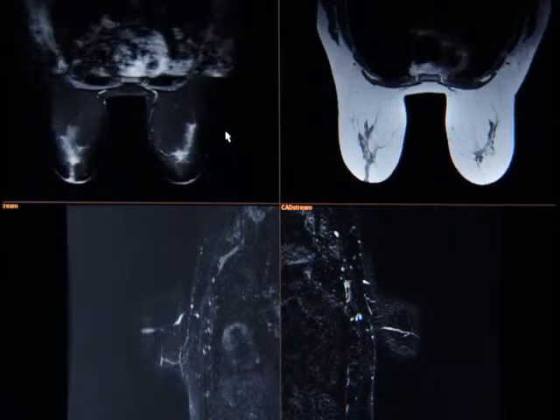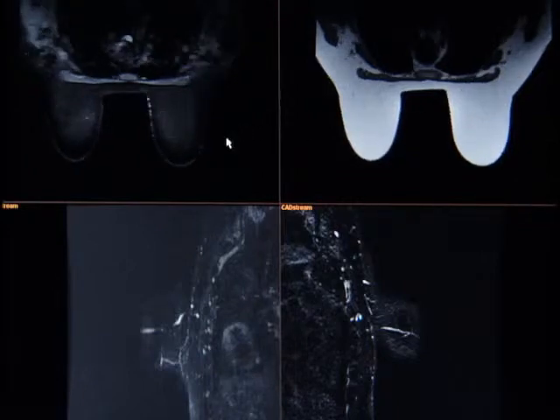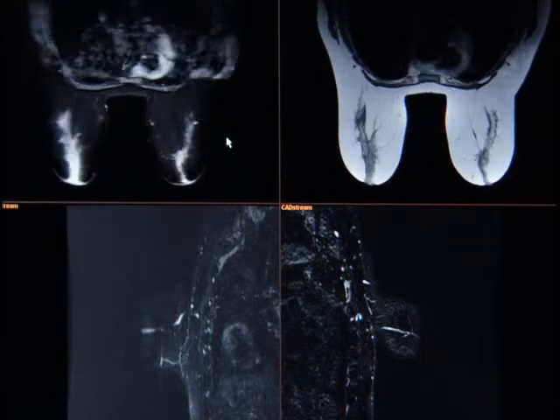I would then go on to delineate cysts or asymmetric breast edema. There are no dominant cysts within either breast, period. There is no asymmetric parenchymal or skin edema, period. No lymphadenopathy is identified, period. Again, you can see on these high-resolution images, you're able to evaluate the axillary lymph nodes, looking for normal reniform configuration with smooth cortex.